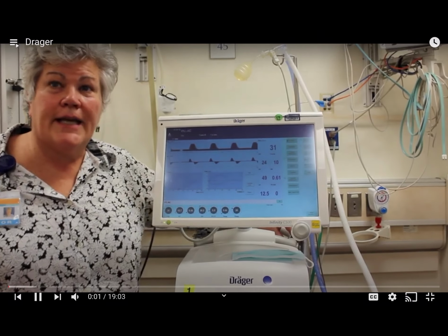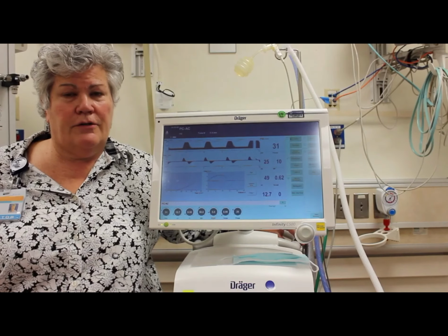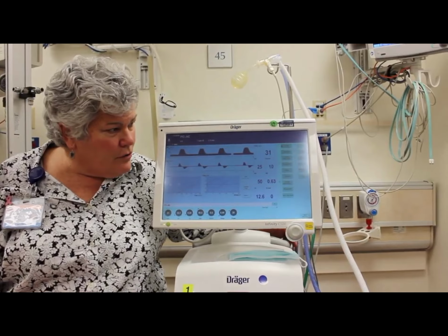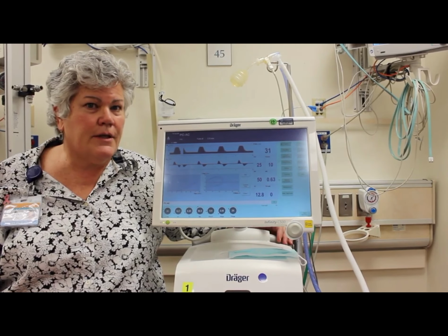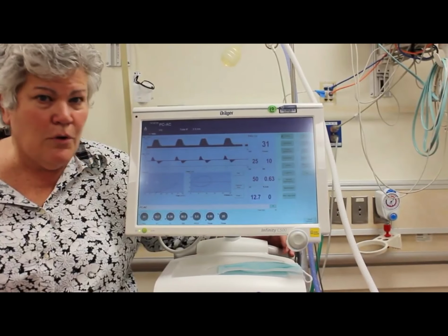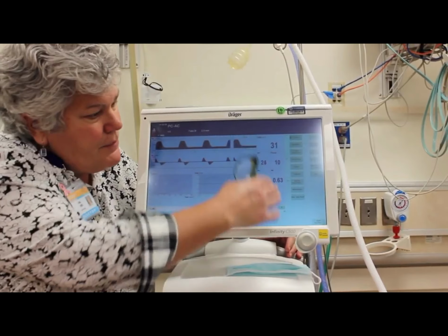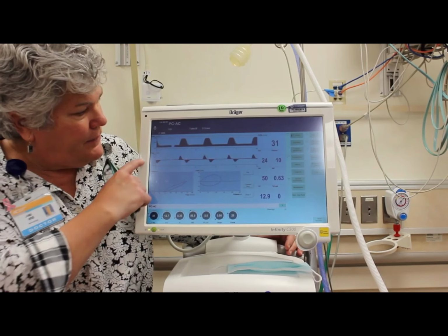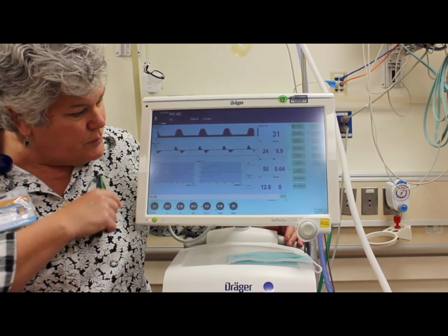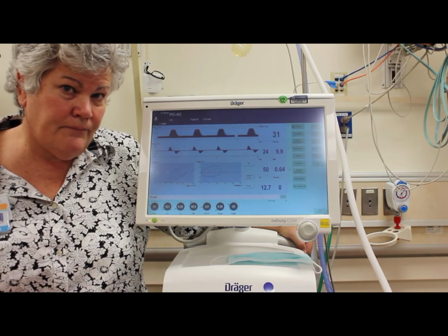Here we are for our second lecture. I'm here with Rose. We're going to be talking about the conventional ventilator that we use in the NICU called the Draeger. Although the Draeger looks very complicated, it's actually pretty simple. We're going to be talking about the different modes that we use. Rose is going to be telling you what each of these numbers mean. We're going to be talking about the graphics that we have set up for you for each patient, and then we're going to be talking about some troubleshooting.